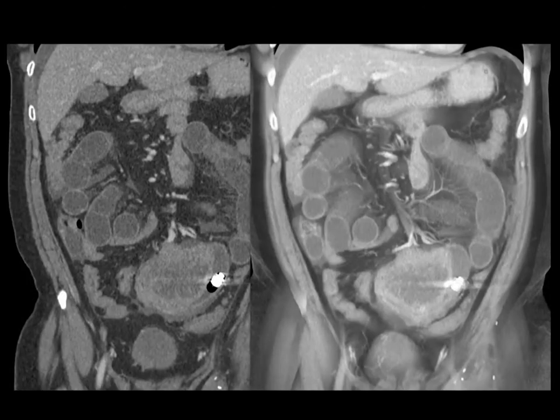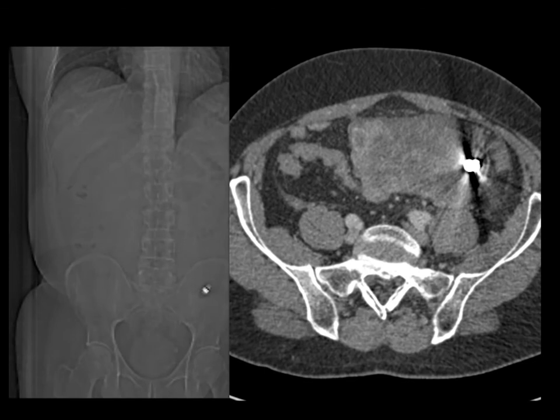And so one thing we know is before you do capsule endoscopy, you need to make certain the patient doesn't have adhesions or bowel obstruction. So often the CT is done anyway. In cases of occult bleeding, if you can't find anything, then a capsule would be worthwhile. But again, it's a lot of false positives and false negatives. And again, just a very nice look at the capsule.